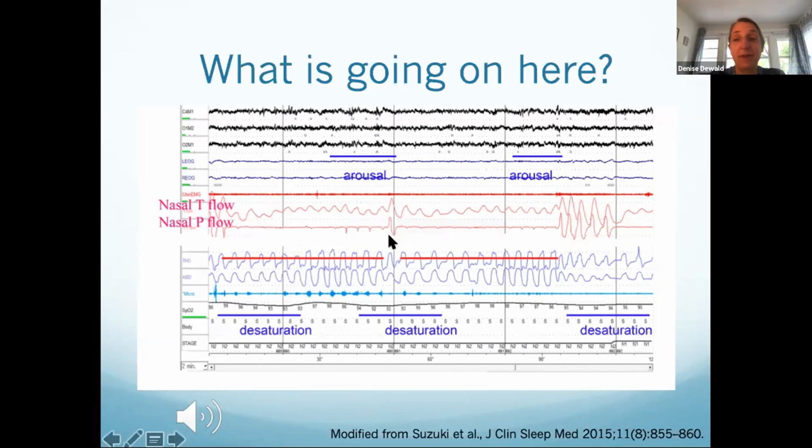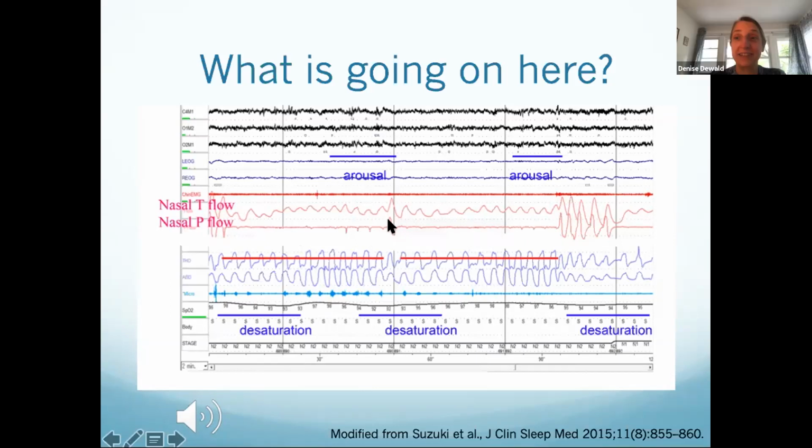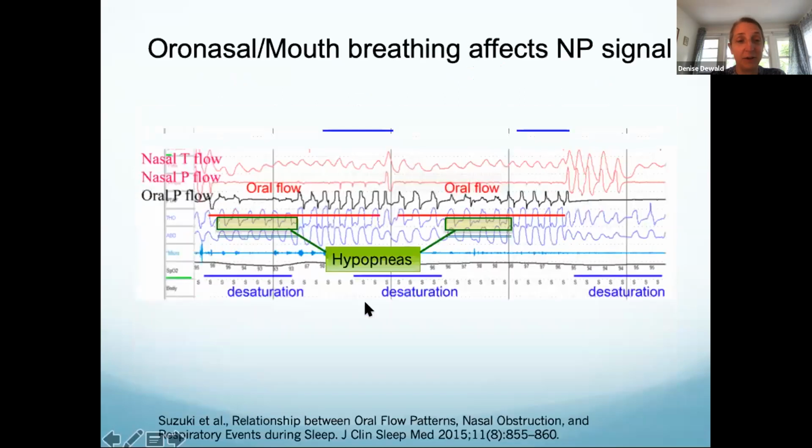Now the funny thing with this is that if you look at the definition of hypopnea, you have like two normal breaths, but we haven't, according to this, right? So there's definitely something going on. I agree. So this is just going to show you what's going on.